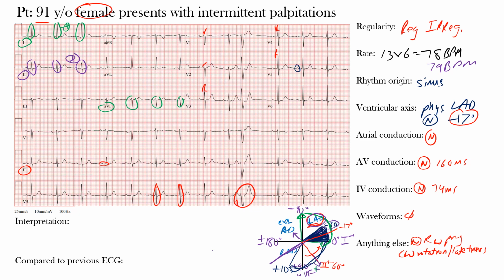So just so you're aware of what we mean by this transition, in the precordial leads, which are these leads here, V1 through V6, the chest leads, we want to see the lead where it goes from mostly negative to mostly positive, and the most isoelectric lead, if we see an isoelectric lead, that's where the transition occurs.